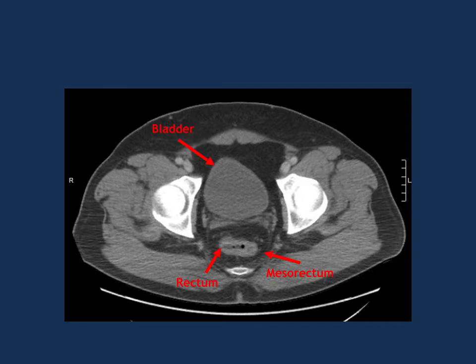And just look at it real quick for yourself. On the outsides of the scan, that's the outside of the scanner, it's very black. Then the next thing that's dark, but less dark, is the fat around the colon, or the rectum. Okay. So that all makes sense.